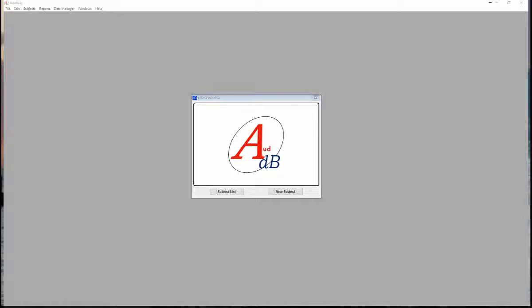We also give you the option to create a custom audiogram to meet your clinic's needs. If wanted and for a fee, we can build an audiogram specific to your clinic from a blank sheet of paper. Another key benefit of AudBase is the availability to view threshold trends over time through our multi-form feature. And then we also include a back-end query generator for purposes of admin, marketing, and of course research. Anything and everything recorded in AudBase can be searched.